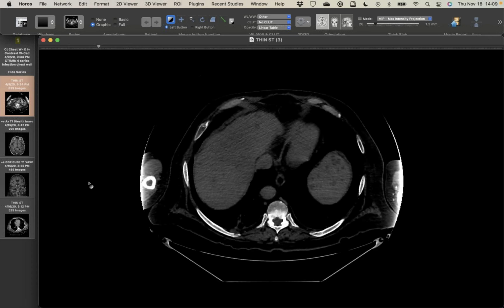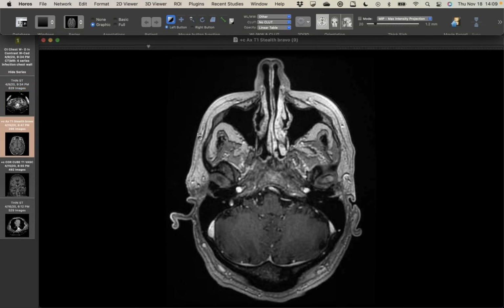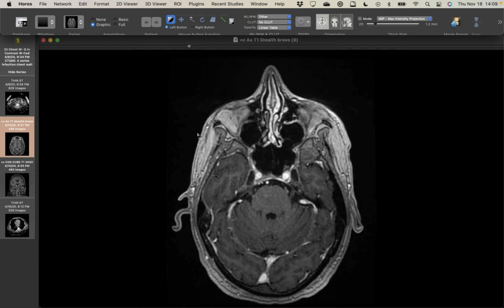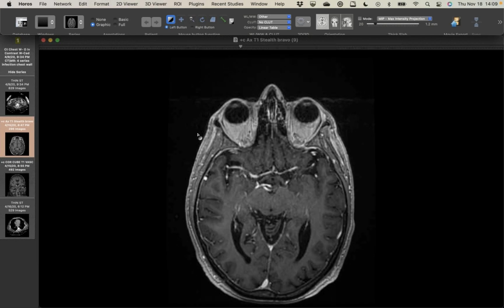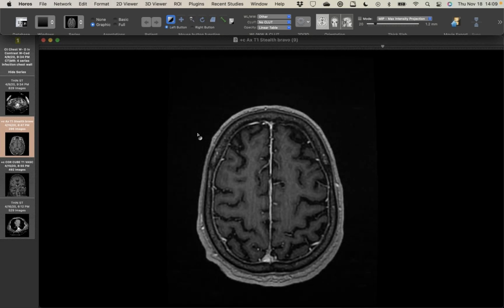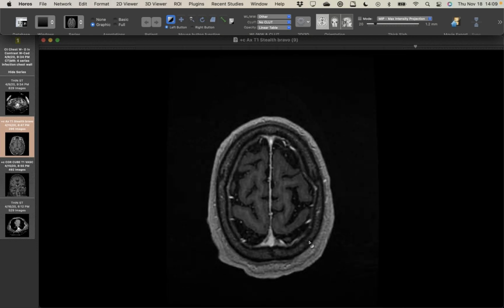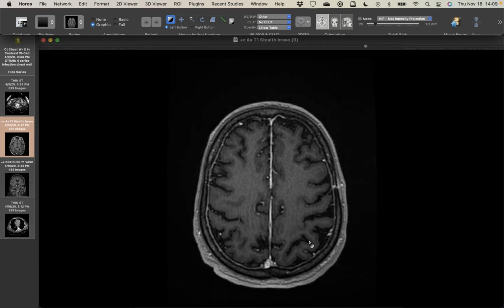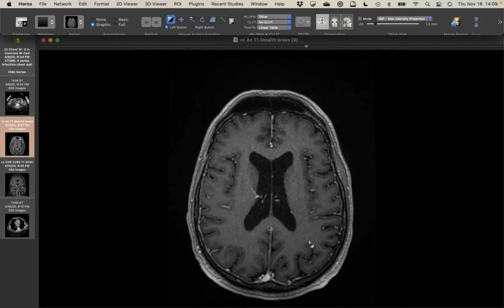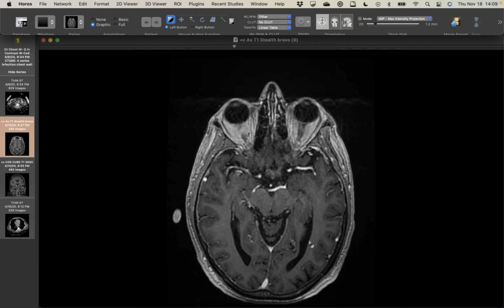They did some other neuroimaging, so I just grabbed a couple sequences. Hopefully I can remember where the abnormalities were. They weren't the most obvious. I think there were some frontotemporal lesions, but this patient had, oh no, it was calvarial lesions. There's one there. So this sort of peripherally enhancing calvarial lesion. Some more of these bone lesions. And so they were worried about PTLD or some other malignancy.